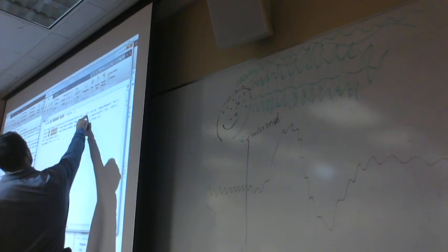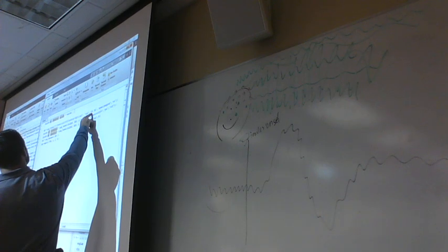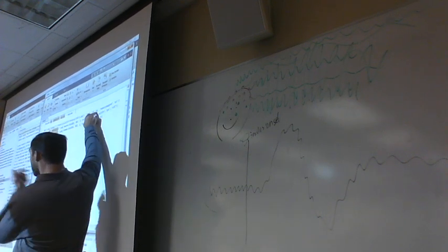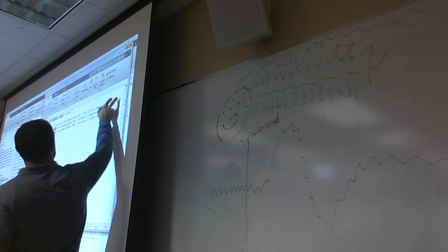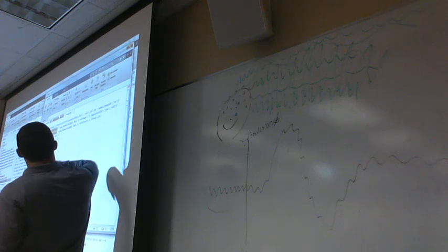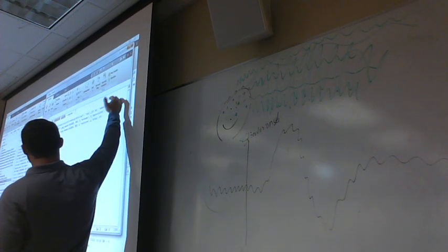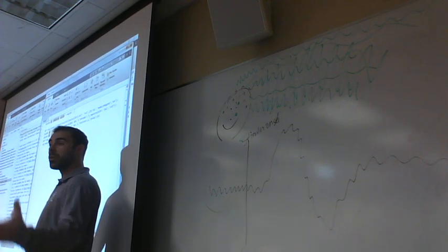Then it says we selected a reference electrode, and it's the average of channels 33 and 34, which we already know is our left mastoid and right mastoid. Okay? And then we just left this on. That's just whatever. Don't worry about that. Then it has a little semicolon, so it goes down to a new line. Then remember, when it was done, it asked us, do we want to open this file?